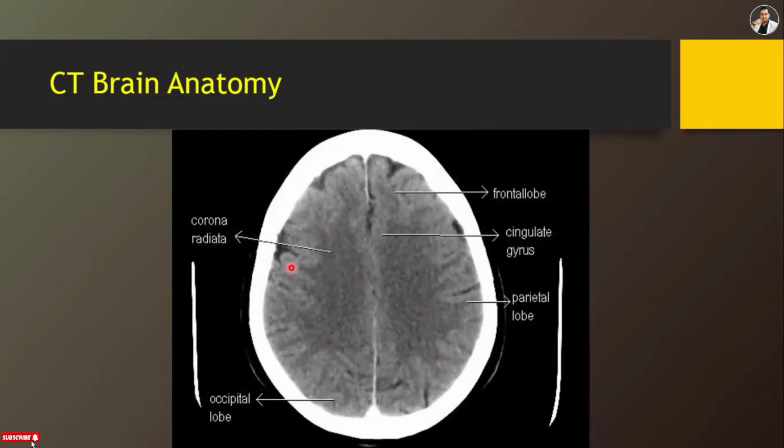And what is on the outside? There is gray matter on the outside. The peripheral side is gray matter. The cortical tissue is on the outside, and there is no fat in it. So these areas are very white.